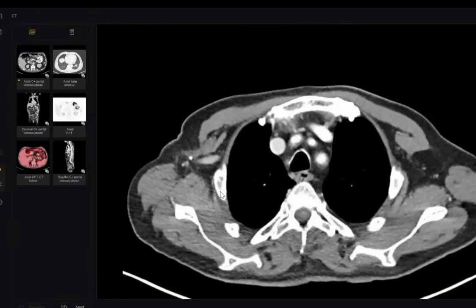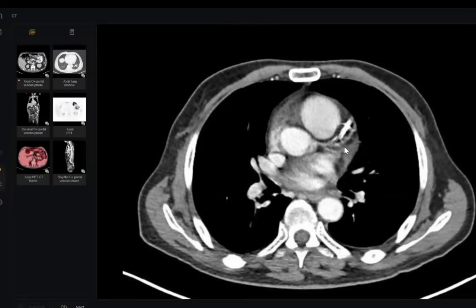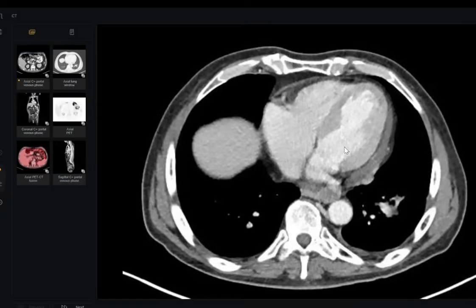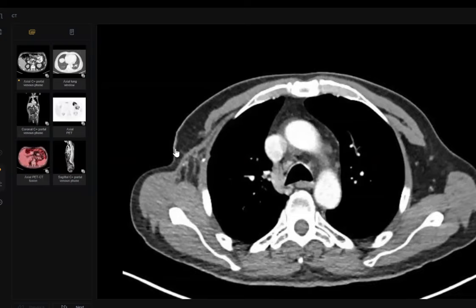Sir, can you show me the breast shadows? Is this a male or female patient? You forget the history, and the examiner will never repeat the history. I think this is a male patient. What happened for the skin here? The skin appears puckered and retracted.